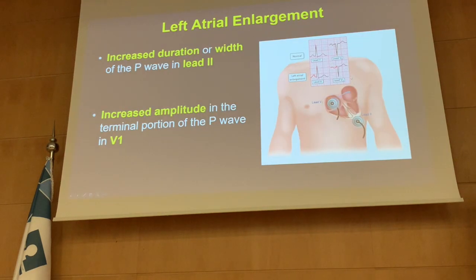So now, first one, our patient, she has stenosis. This is the normal patient, and this is the abnormal patient. In lead II, you will have like two portions, or bifid, we called it bifid before, but we don't use this terminology anymore. And in lead V1, you will have a positive and a negative wave, like two waves. That means the ECG is according to the atrium, which means left atrial dilatation. Remember the scenario, because you cannot answer atrial dilatation at a student level except if you read the scenario.